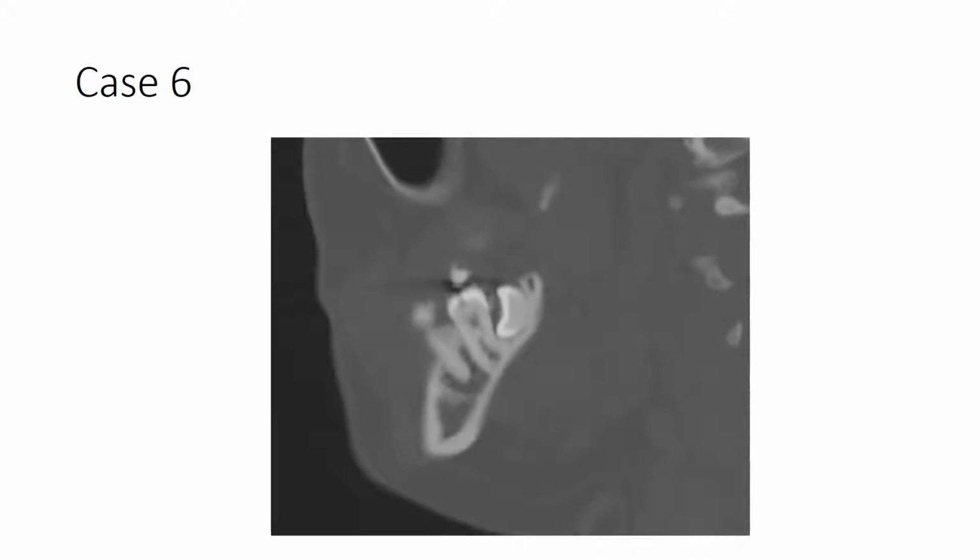This slide demonstrates a special case of periodontal tissue loss. In this sagittal section of a maxillofacial CT, there is a horizontally impacted mandibular third molar, causing a vertical bony defect of the distal aspect of the second molar. This situation is highly unhygienic and active periodontal disease is likely present.